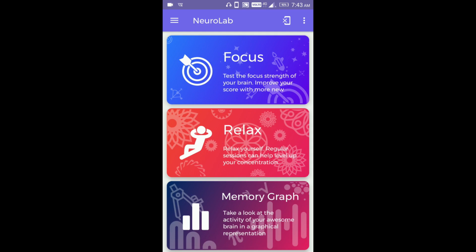The icon at the top here for the mobile screen disconnection will be changed to the connection icon once the device is connected, and we can move on from there. So yeah, that's it basically for this screencast video, and this was basically my overview of my work on GSoC 2019.